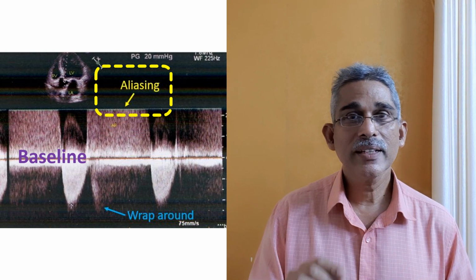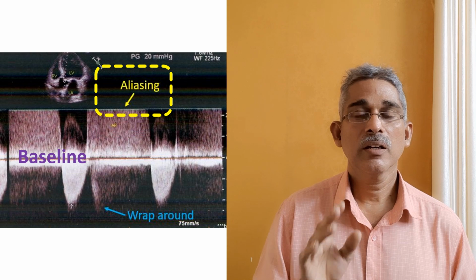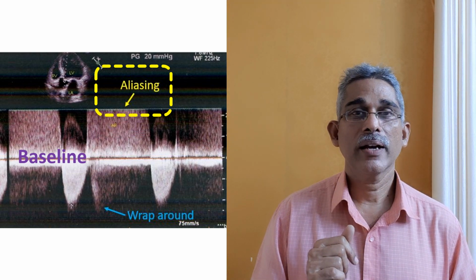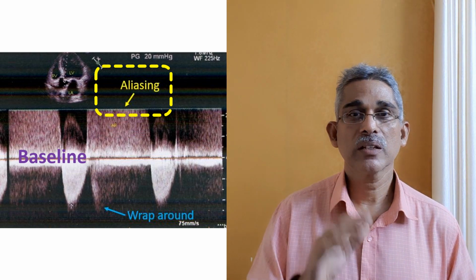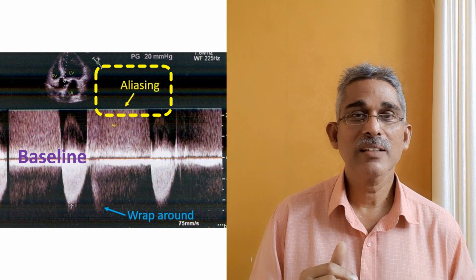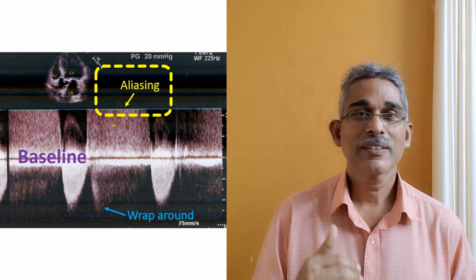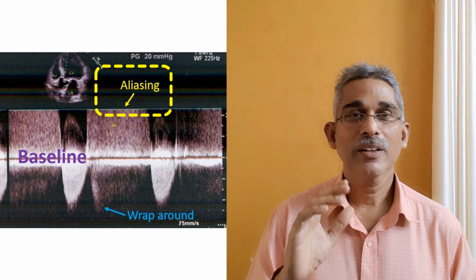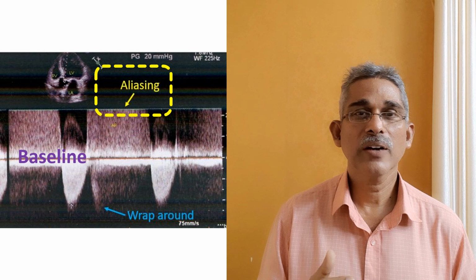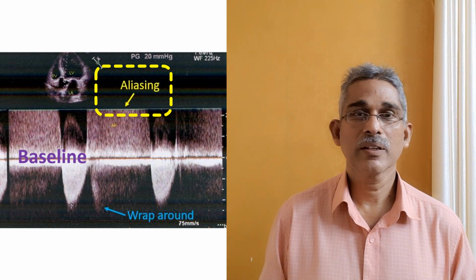When you connect the ECG leads, it's easy to time between systole and diastole. You know that systole starts from the peak of the R wave and ends towards the end of the T wave. That is the usual period of systole. Otherwise, sometimes what you think of as a diastolic jet may be a systolic one and the other way around. So, for any good measurement, you have to have timing with ECG. Every echocardiograph has ECG leads and you can attach the ECG leads and time it.